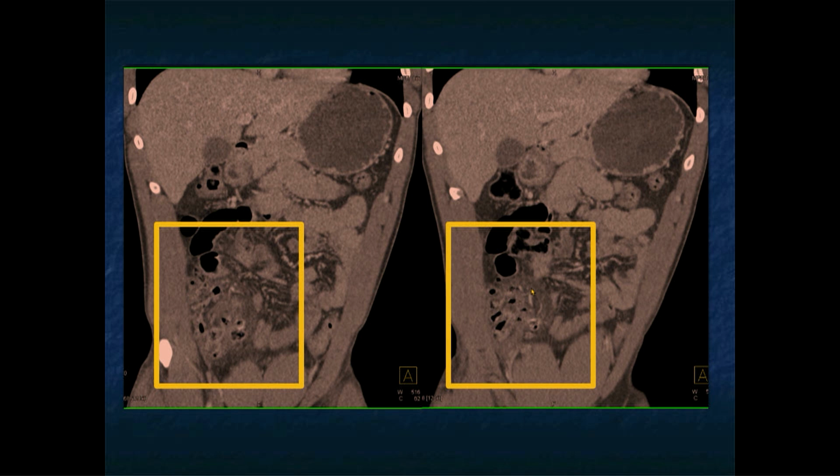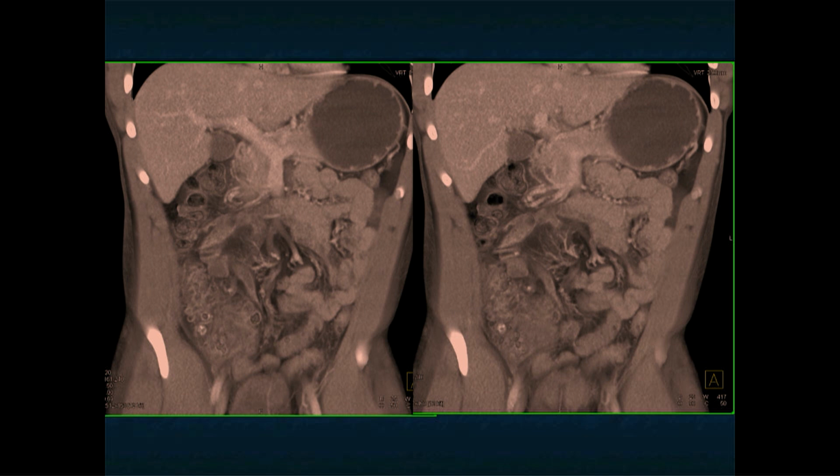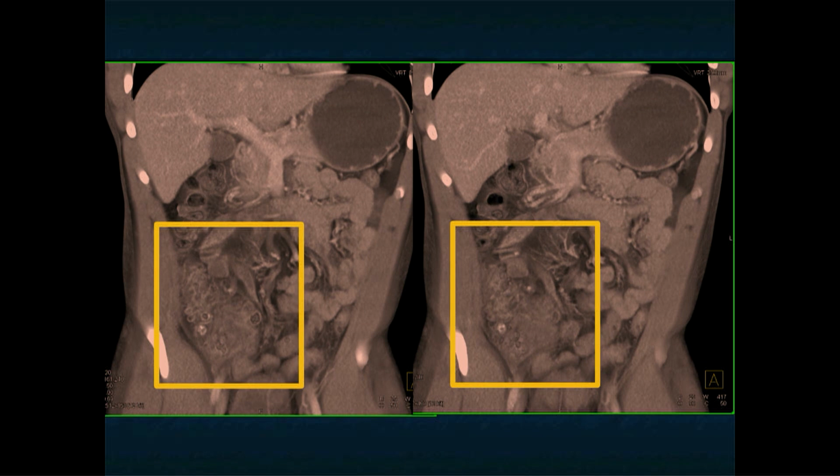So it's a very important etiology. Again, it's a good example of where the inflammation in the mesentery is really the thing that you need to focus on. So mesenteric inflammation, Crohn's disease with the prominent vasa recta, the fibrofatty proliferation, and small bowel diverticulitis with lots of inflammation and multiple tiny air bubbles.